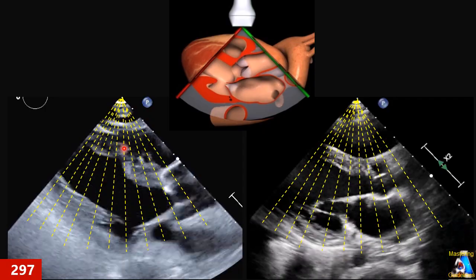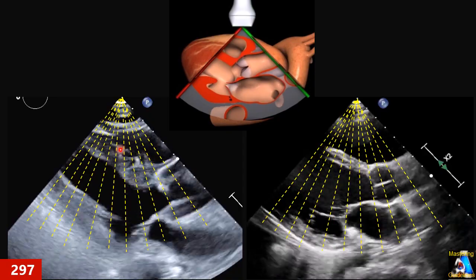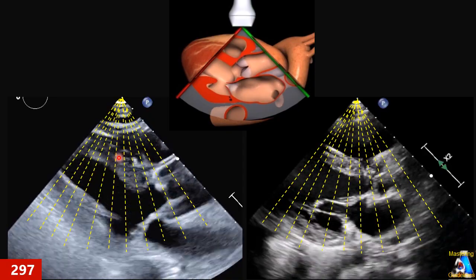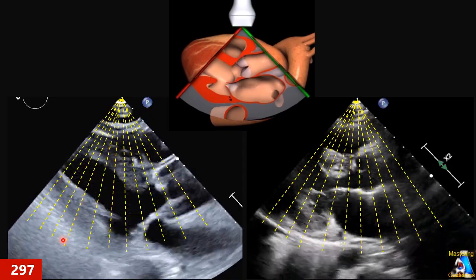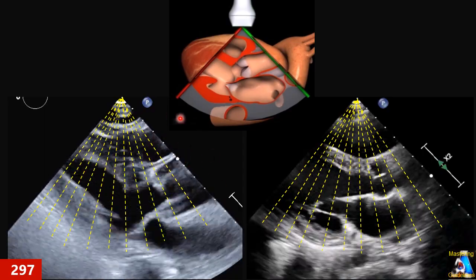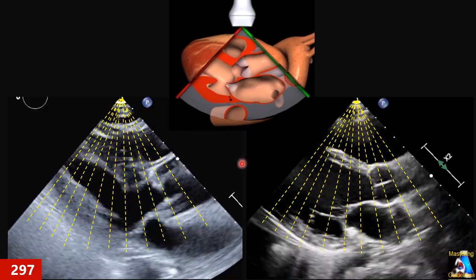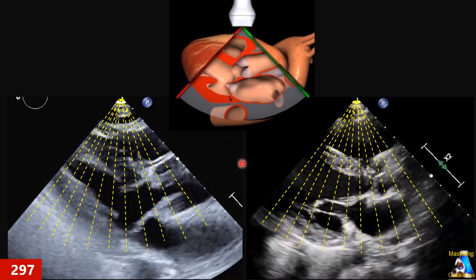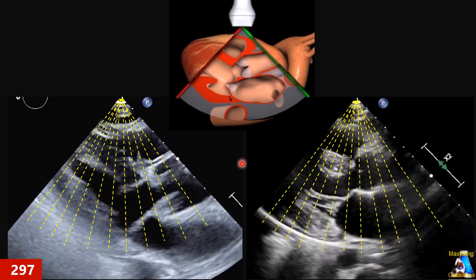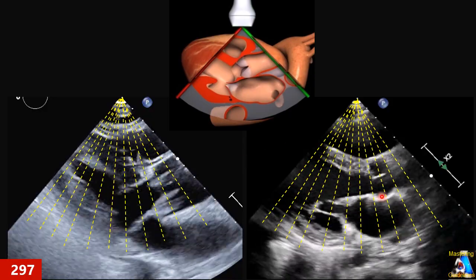You can see the best spot for this measurement, if you want it to be perfect, is at this level, close to the papillary muscle level. It is almost perpendicular and highest resolution. But again, this is a general rule. Just remember, as I mentioned in another clip, in apical three, if you don't have PLAX, you still have an option in apical three.